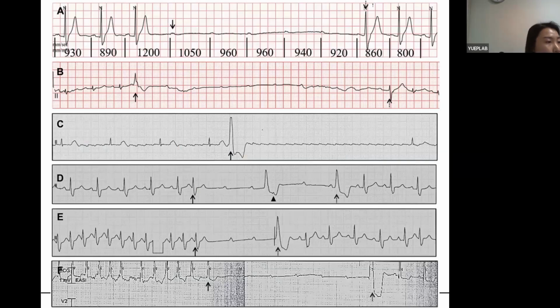I think this patient before the operation had about 25% PVC. After PVC, AV block occurred. So I suspected conduction system disease. However, after PVC ablation, there is no AV block. So I think we still need a device.